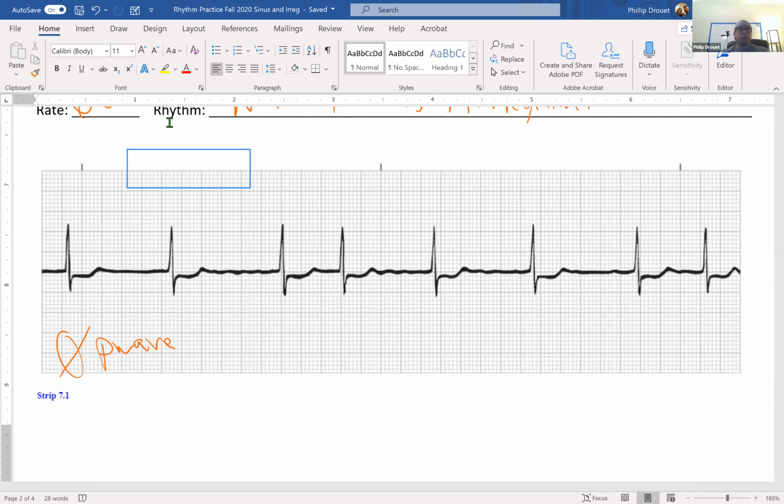But all the ones that we've talked about, except for one, will give us a distinct P wave, right? And in this rhythm, remember what happens is you have multiple cells firing. Pretty much every single cell in the atrium is firing, but not one cell completely depolarizes the atrium 100%. So you have what we have here, which is these squiggly lines across the baseline or the isoelectric line. Okay. So because I have no P waves and I'm irregular, this helps us understand that this is atrial fibrillation, AFib.